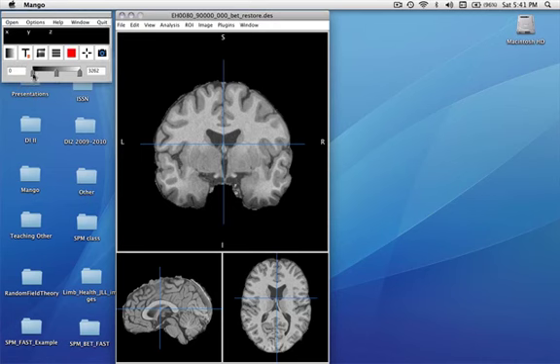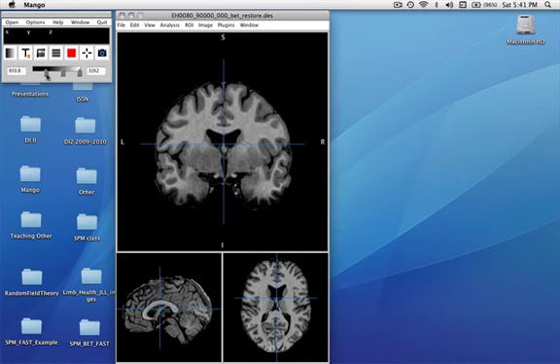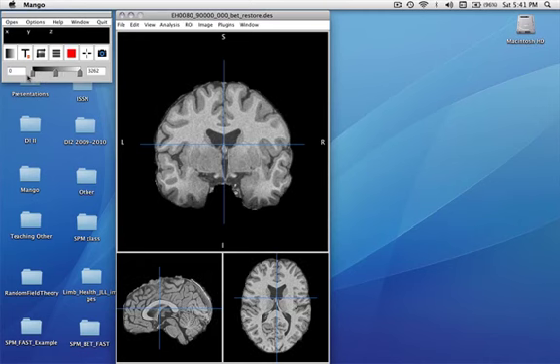This one adjusts the black level, and presently black is set to be for 0 values in the image. We can change where we want black to be. The other end is where we want white to be. And the one in the middle is where we want gray to be. And so there's a variety of ways of dealing with this.